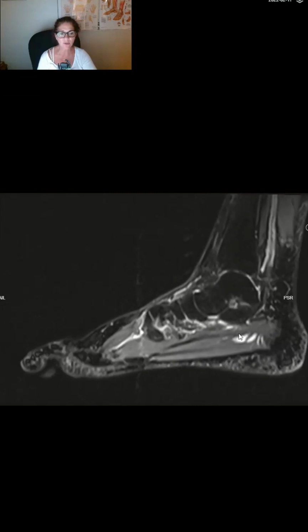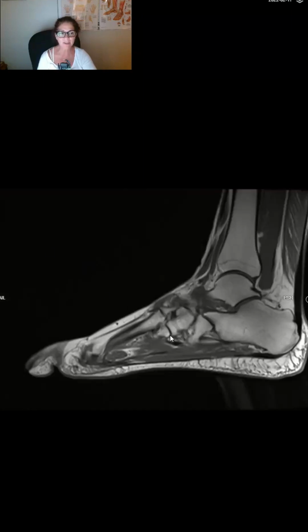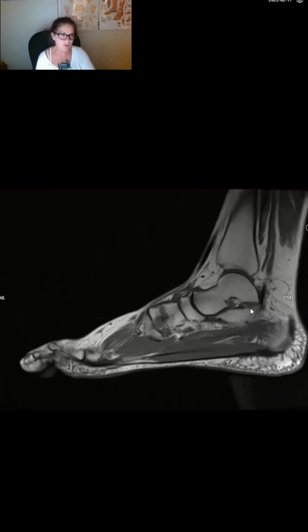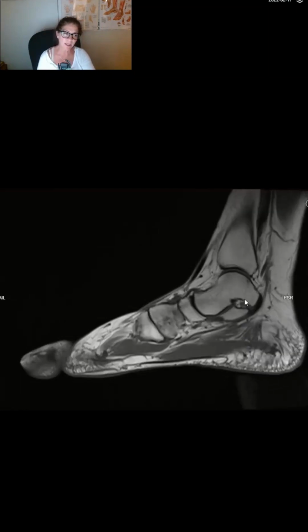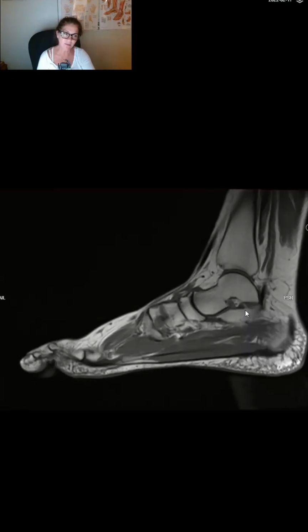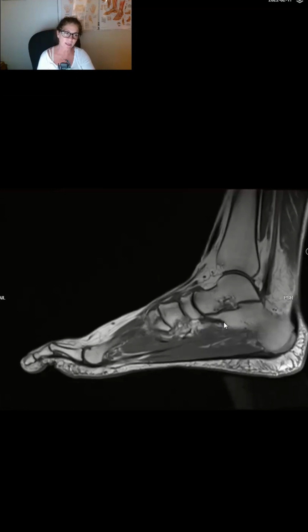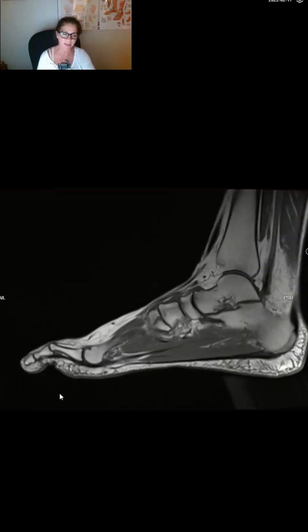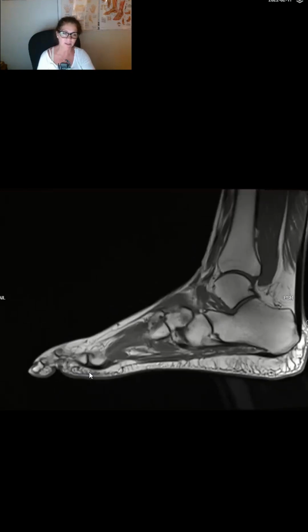I would like to go back into my hindfoot now, and because it's a wide field of view, it's kind of difficult to see, but I think you can appreciate the extra-articular anteromedial talocalcaneal coalition and this exaggerated facet that's locking this region. And so there's an anatomic predisposition to altered biomechanics here, which may create the situation as in rearfoot varus, where the patient has exaggerated heel striking and then uncompensated biomechanic to get to toe off.